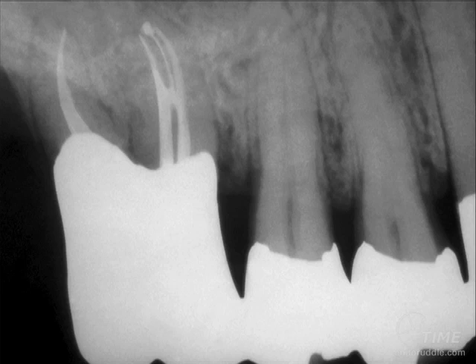This is a 23-year recall. So notice when each discipline performs its step properly, periodontally, endodontically, and restoratively, you can get these long-term results that can compete absolutely favorably with implants. But the secret was complete endodontics.